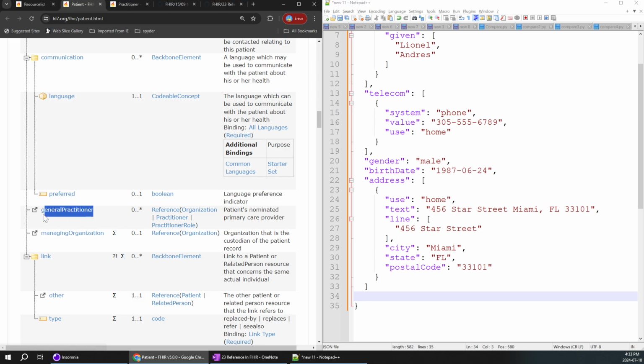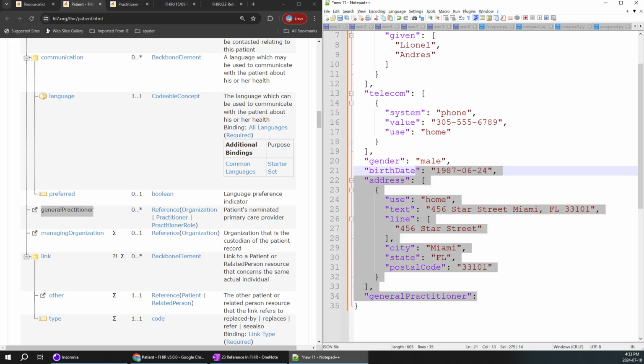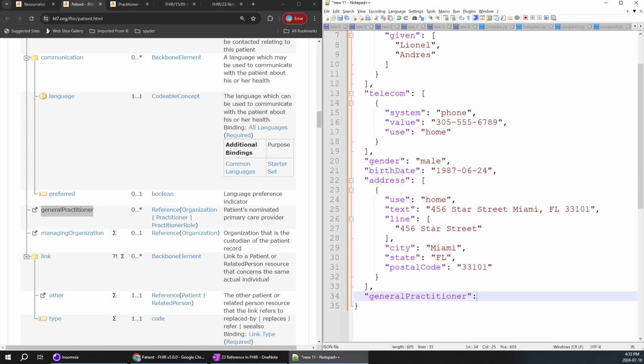You can copy this directly. I hope the URL will not get copied. Yes, that's easy. And you can give the double quotes. And over here, as we are giving an extra object, you can give a comma. It's mandatory. Yeah, you can give a colon. And I taught you in a previous video how to build a structure, so that would not be a problem for you, or else you can refer to the previous videos. I'll give an opening flower bracket and a closing flower bracket.